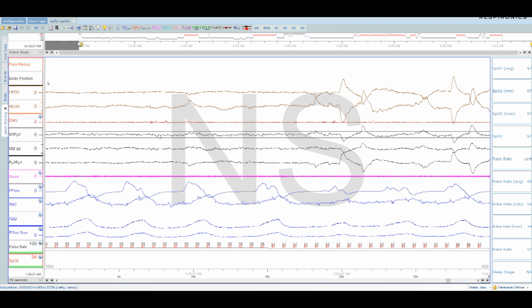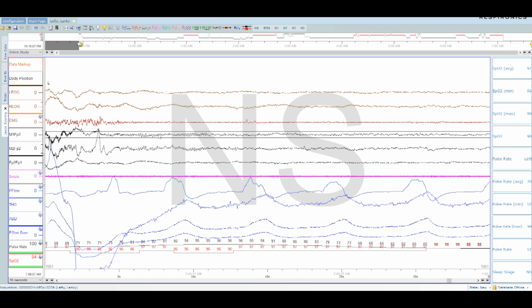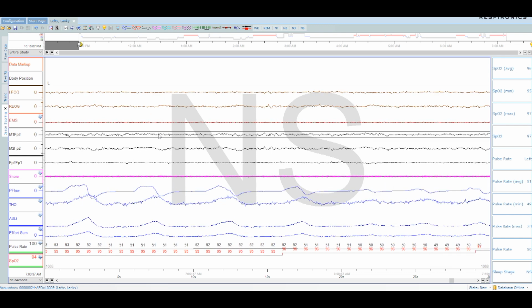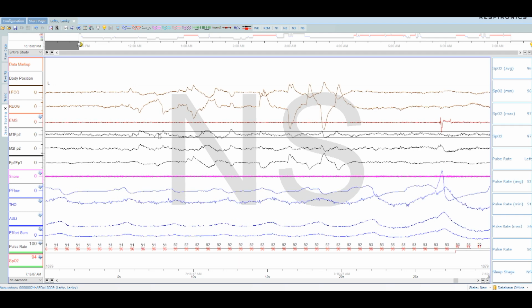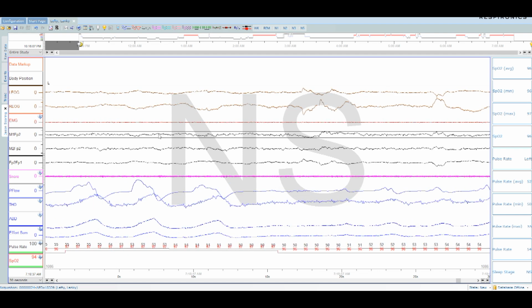By the way, we're back in REM. Big eye movements. That's one thing I'm really glad I did. While my coworkers were all screwing around doing whatever, I really dove into this and really paid attention to it. And I'm so glad I did, because I think it gives you all kinds of insight as to what patients are actually doing during the night. And you can really learn a lot.